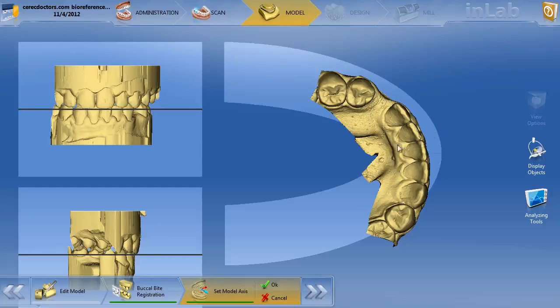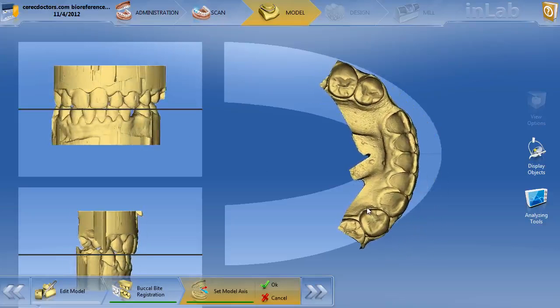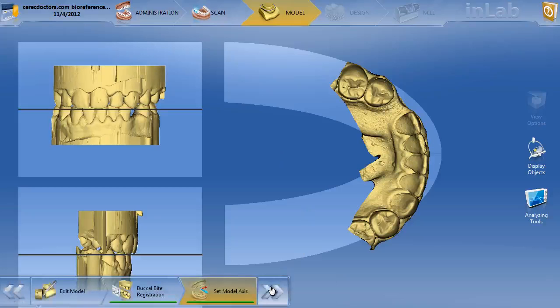So in these cases, what I would probably end up doing is pay less regard to the one I usually use, the upper left, and just use this horseshoe to align the midline, making sure my inclination is pretty good. You can see that your upper central incisor midline is here and the lower's here, so you almost have a two-tooth midline discrepancy, which is unusual. So we just have to pick an average spot and go with it. We'll hit OK and move on to the margination.